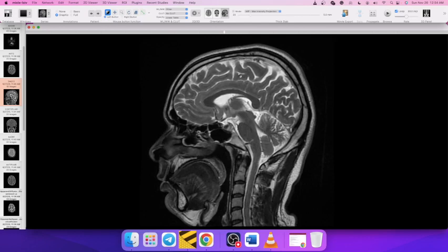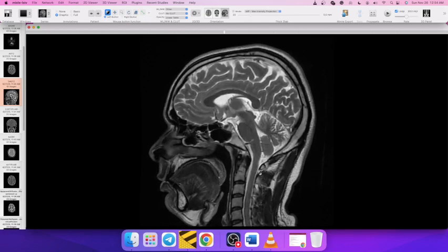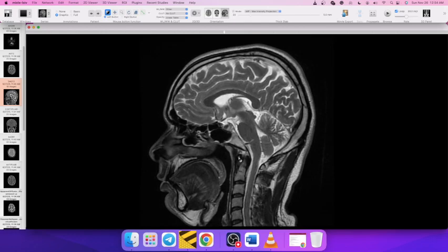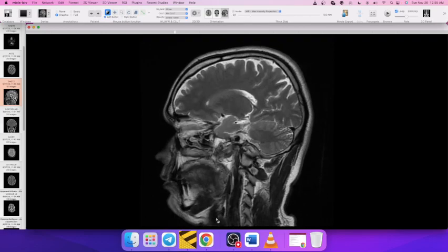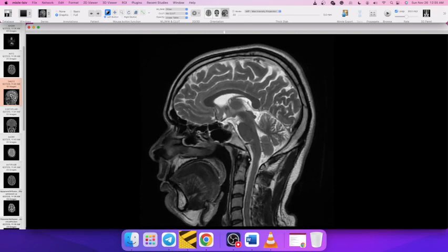Look for tonsillar herniation. It doesn't have any. It's well above the foramen magnum. Make sure to look for fusion of the C2, and sometimes there is atlantoaxial abnormality. Make sure you look for the distance between the dens and the anterior arch of the C1 vertebra. Always make sure that you look at the tongue, the nose, and the mouth, because sometimes the thyroid is seen, because sometimes there's an obvious finding but we just miss it because we are not looking there.